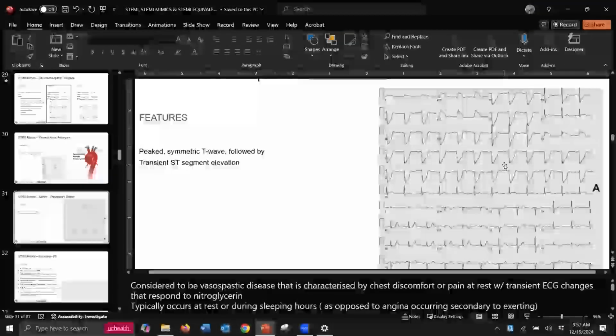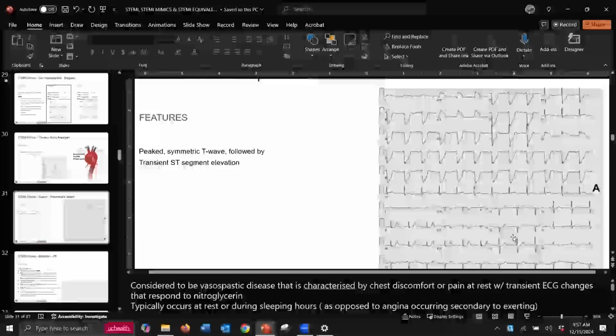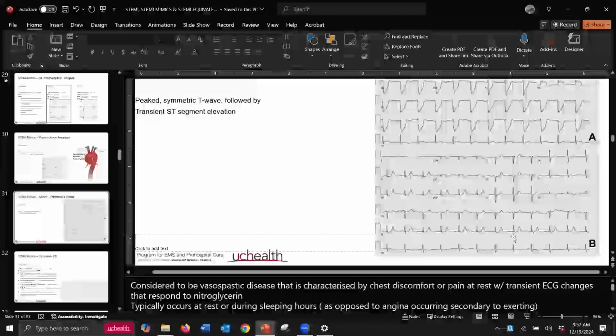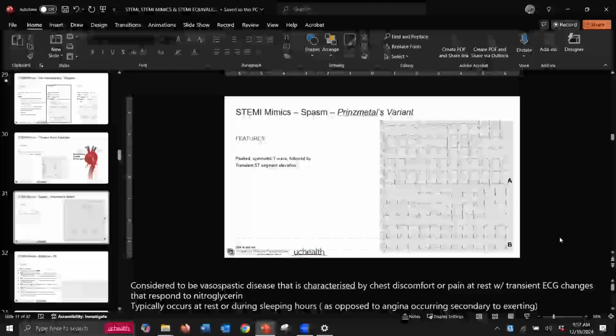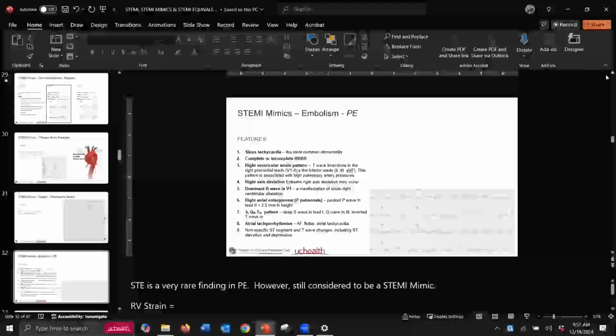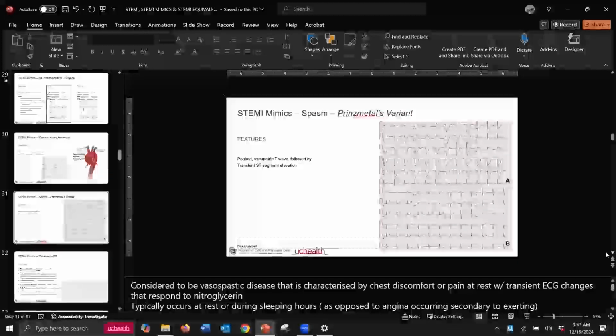And you give him some nitro, like a good paramedic does, and you take another 12 lead, and that's what it looks like. And you go, oh, yeah, hey, ER, so, what's worse? Yeah, it's bad. It's really bad. Okay, it typically does very well with nitrates. It's an unstable anginal pattern. But it is transient. That's the key.